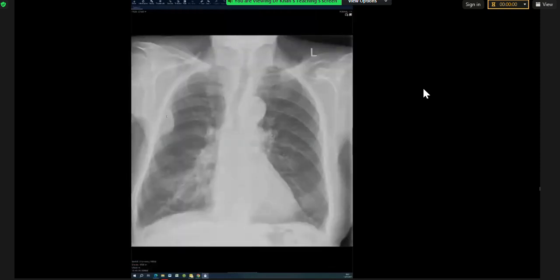But the take home message for you is you have to pick the bone, because that's what decides malignant versus benign. When the margins are this smooth, it could very well be a benign lesion. It could have been there 10 years ago. But if you pick that bone destruction, you can very quickly get out of the X-ray, escalate, and move on to the next case. But yeah, well done.